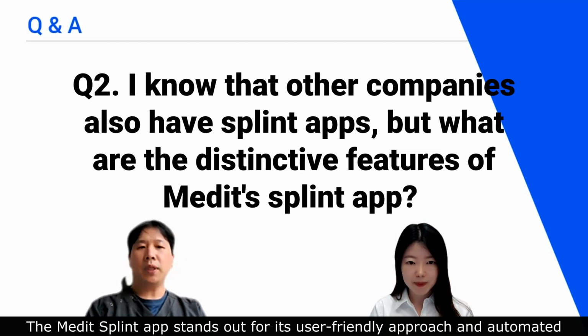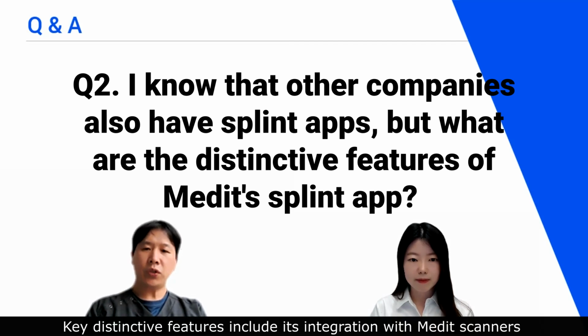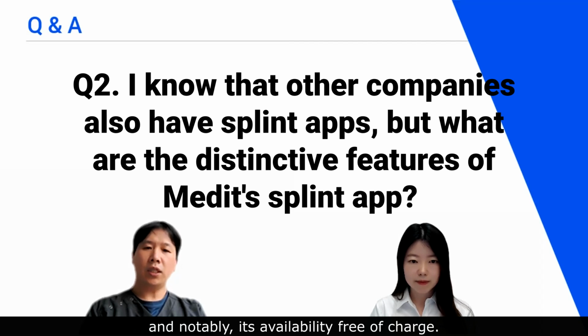The Medit Splint app stands out for its user-friendly approach and automated workflows, which simplify the design and manufacturing of the dental splint. Key distinctive features include its integration with Medit scanners for high-quality digital impressions, customization options for patient-specific needs, and notably, its availability free of charge.